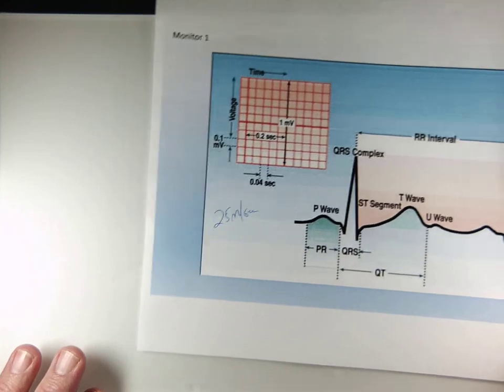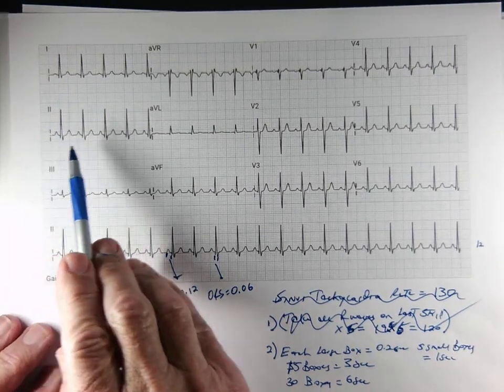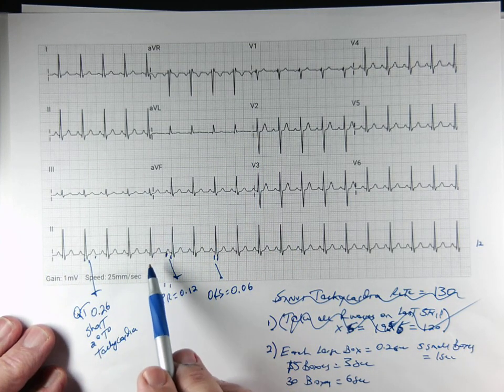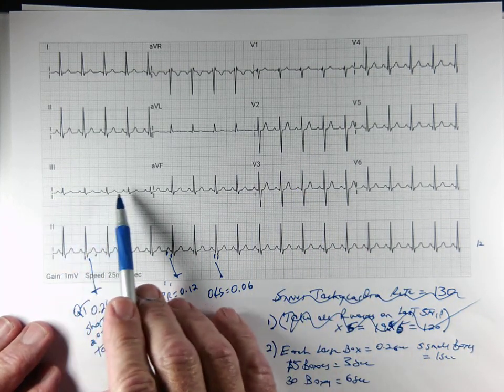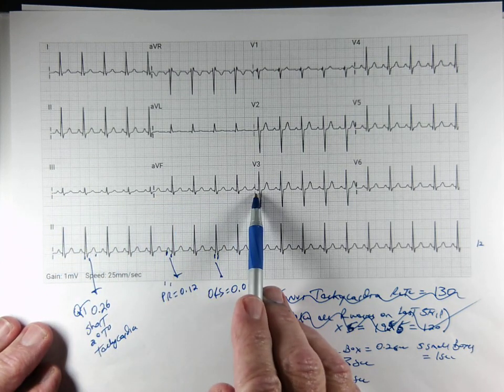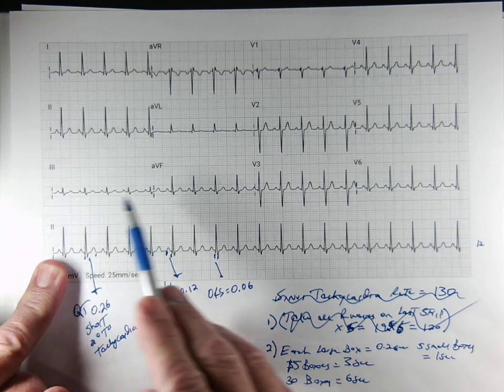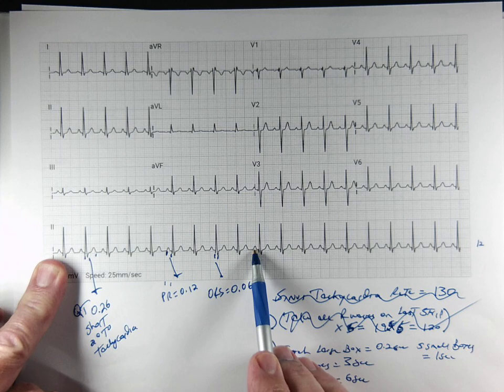So let me get back to this a second here. Looking at the EKG now, you might have noticed these little chip marks here and here and here, and you can see one here and there. Those, typically on normal EKGs, are 3-second tick marks. So if I know that's 3 seconds and to here is 3 seconds, and I come down to the rhythm strip, I know that the beats contained between this check mark and this check mark occurred in 6 seconds. If I count those and multiply by 10, I can get a heart rate.